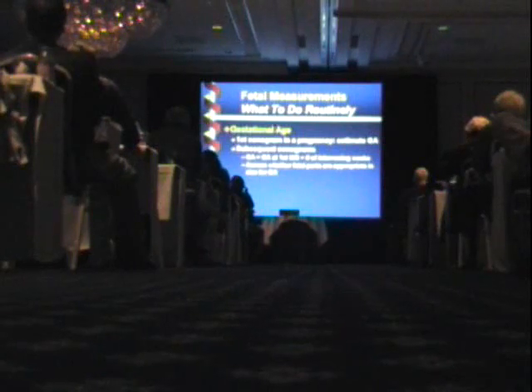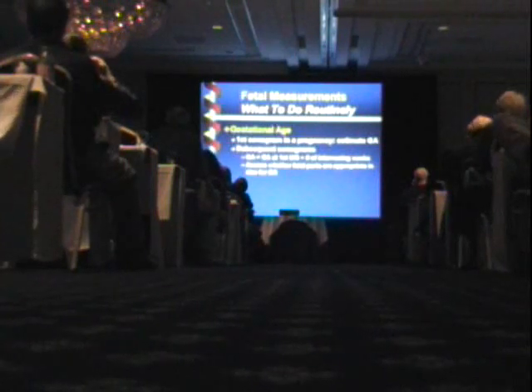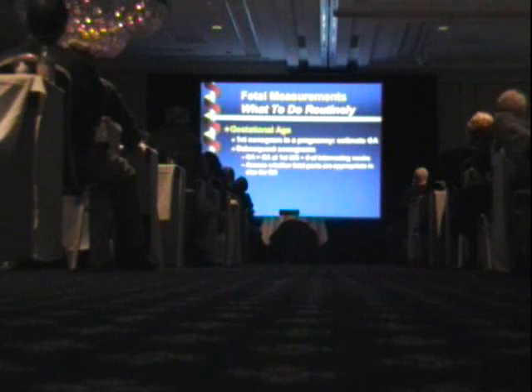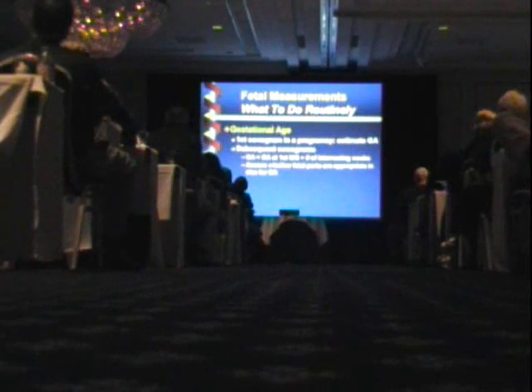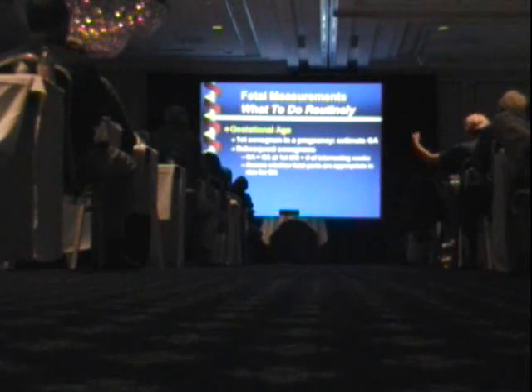intervening weeks. So, for example, if a woman comes in the first trimester of pregnancy and based on your ultrasound measurements, as we'll see in a minute, that really means the crown rump length, at 10 weeks of pregnancy in the first trimester, you date the pregnancy at 10 weeks gestational age.